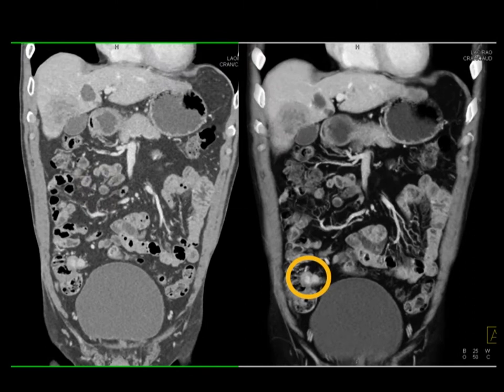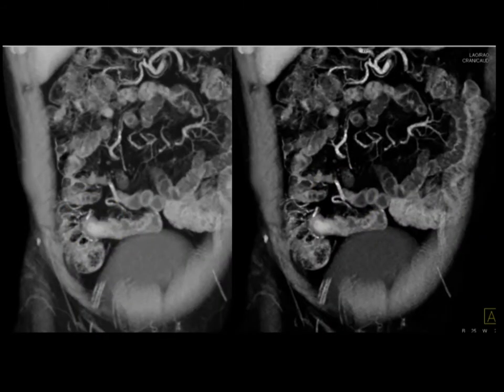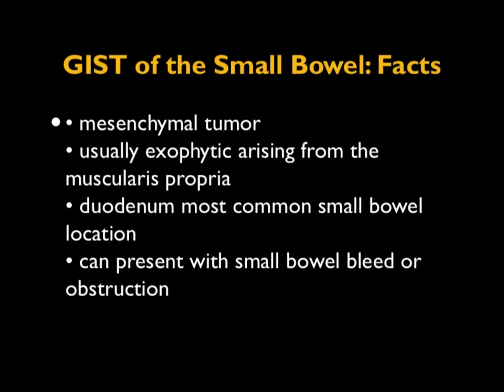There's the patient's tumor. The primary tumor is in the patient's ileum, and the desmoplastic reaction is nearby. Again, very nicely shown here. So again, the appearances, mass in the mesentery, small bowel mass, think enhancement, the importance of arterial phase imaging, especially for liver mets. For the small bowel tumor and masses, the challenge might be that you don't appreciate the vascularity, so it's really only going to help you. And here you can see the carcinoid in the terminal ileum, very easy to miss, but really nicely shown in this example.